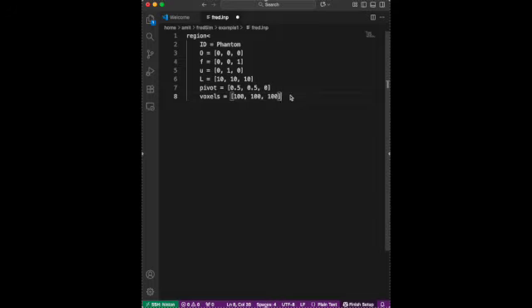Okay, we have our voxel, and of course we are simulating it as a water phantom. Yeah, that's our region. That's done. Now I will define my beam.